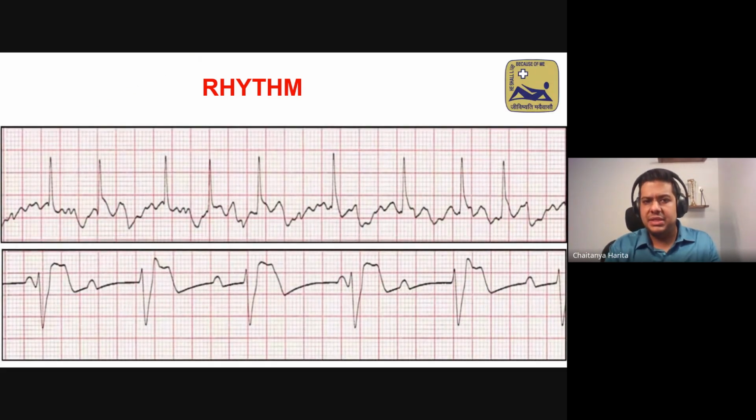So look at this abnormal ECG. I put 2 ECGs on top, right? If you look at it, the rhythm is abnormal. You can make out that the RR intervals are very irregular. This one is 2.5 boxes. This is 3. The rate is irregular, but the rhythm is also. You cannot make out a PQRST complex synchrony. If you look at the complex here, this is P, this is T, this is P again, another P. So this is complete chaos in this ECG.